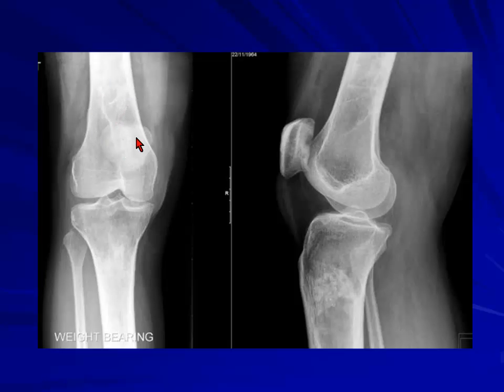If you're looking at the bone scan, you'll see increased uptake at the metadiaphyseal junction of the distal end of the femur and proximal end of the tibia. With the history, it is in keeping with, or diagnostic of, bone infarct.